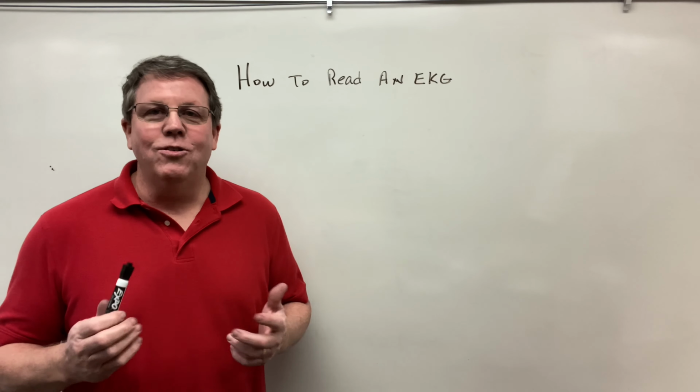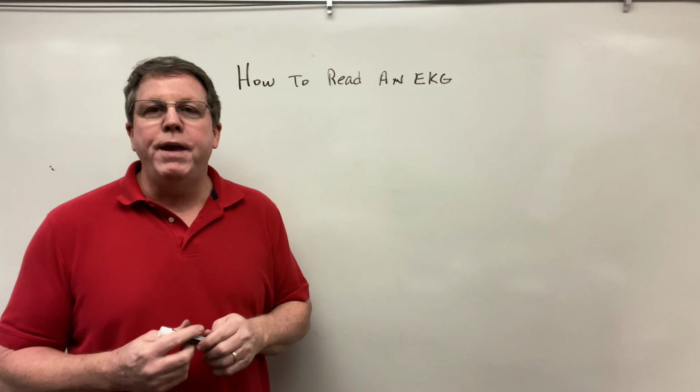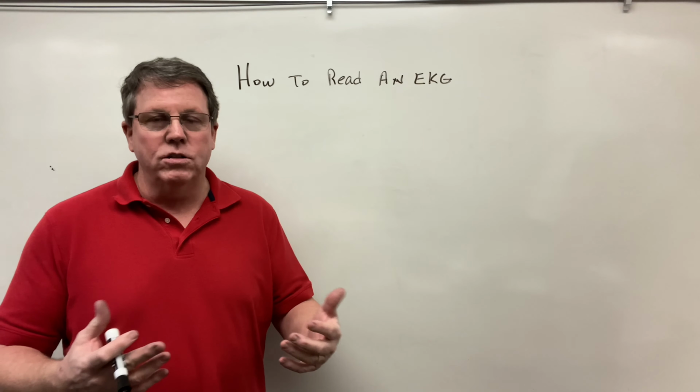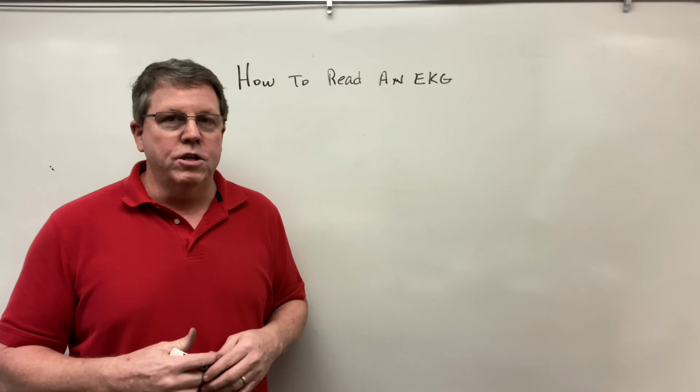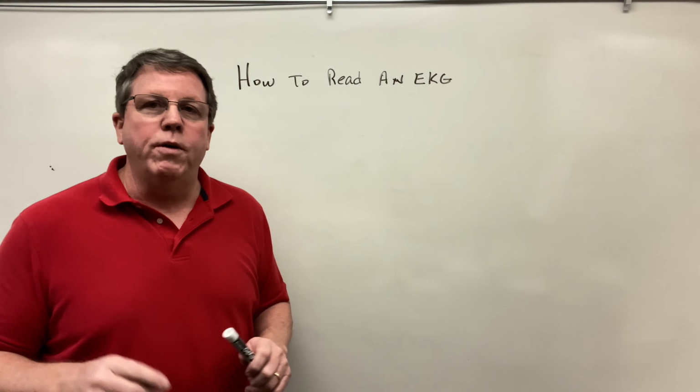Hi everybody. So today we're going to be talking about how to read an EKG. And an EKG basically measures the electricity as it passes through the heart as the heart is going through its cycle of contraction. So let's take a look real fast. And before we start, there's just some terms I want to go over.